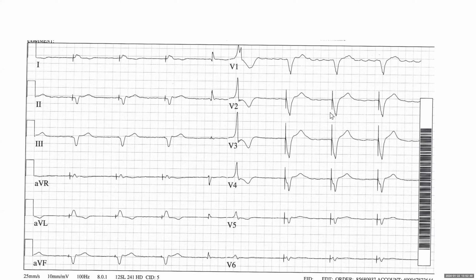Yani, you have to think about a few codes you go to when you're stuck, things like artifact or non-specific. That's a good examinership skill. Good. Any question about this ECG? For the people going to the exam, you need to find yourself with the coding sheet. Yeah, I agree.